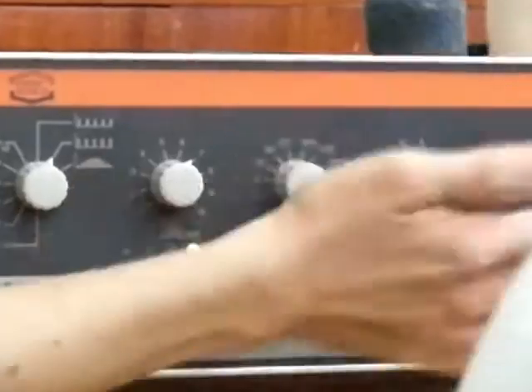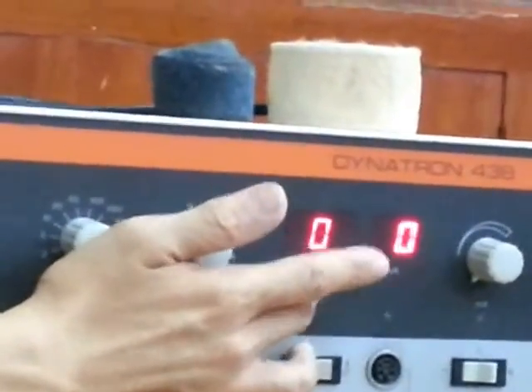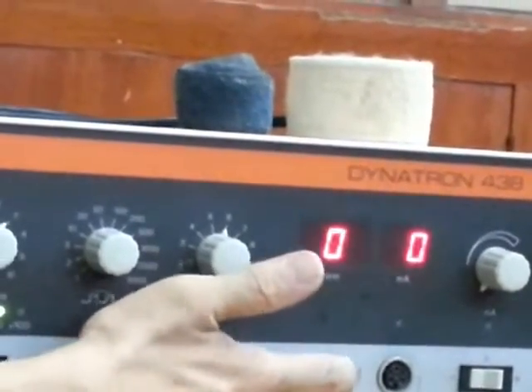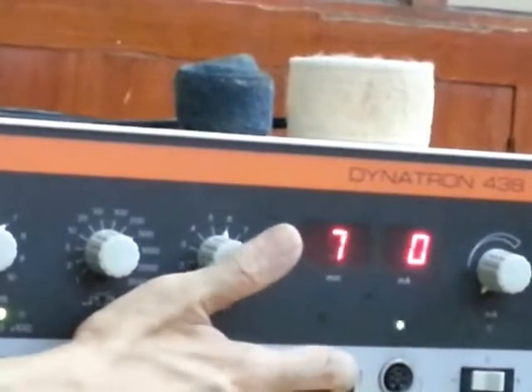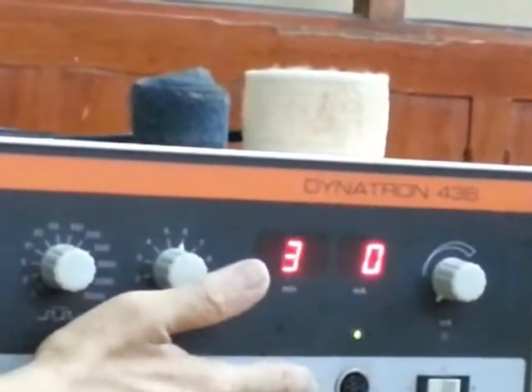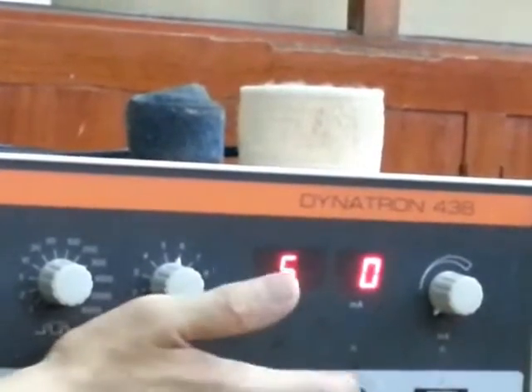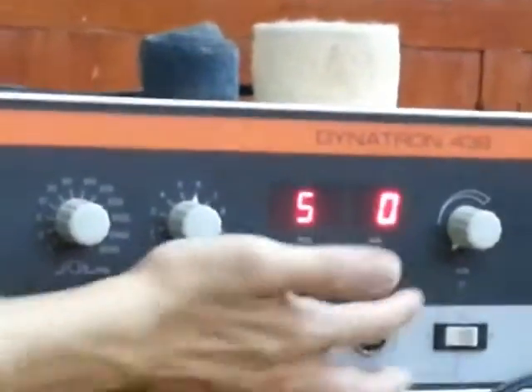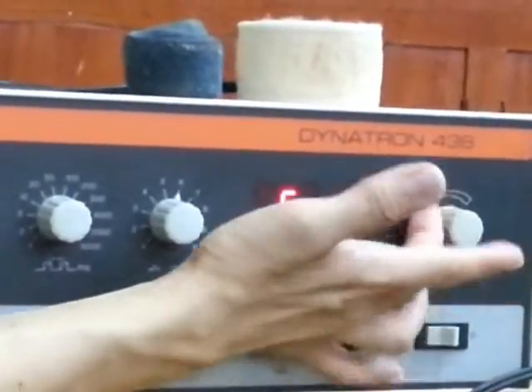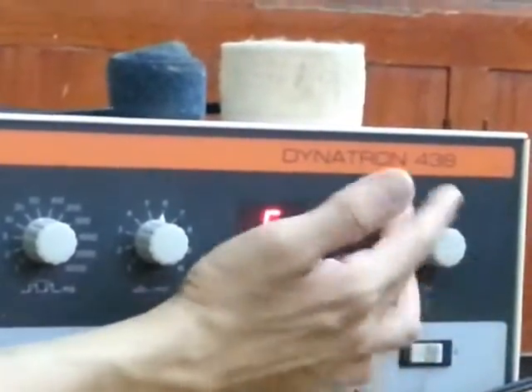Okay, next, this would be your duration display, in terms of minutes. Below you have the adjustable switch wherein you can increase or decrease the duration. Commonly prescribed is 5 minutes, or 5 to 10 minutes. Then this one would be the intensity display. Just adjust the intensity knob here, which is the knob to adjust for the intensity.